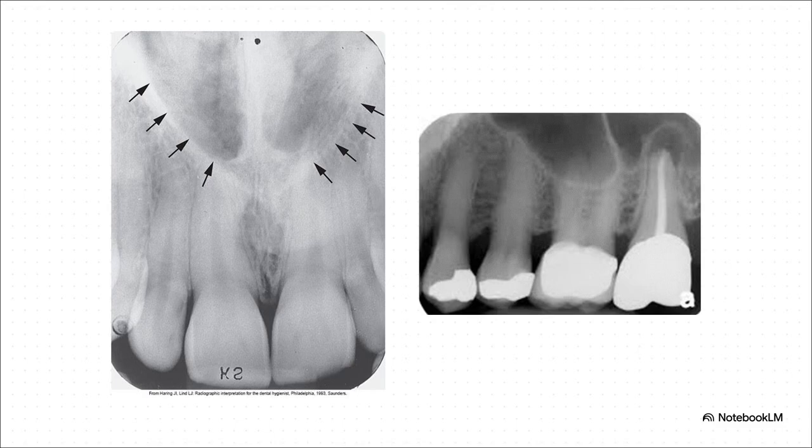And this illustrates the difference perfectly. Over on the left, you see the nasal cavity. It's mostly just empty space, right? So it's dark, radiolucent. But then look to the right at those dental crowns. They are incredibly dense, so they resist the X-rays and show up as bright white, or radiopaque. So just remember this. Dark means less dense, and white means more dense. And with just that one little rule, you're already starting to speak the language of X-ray.